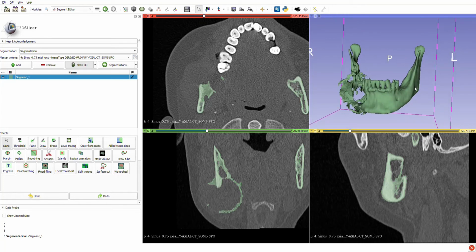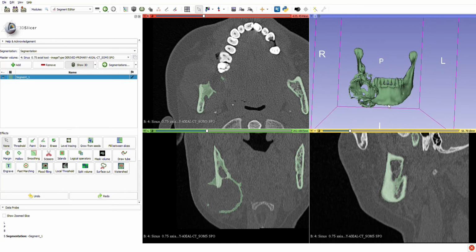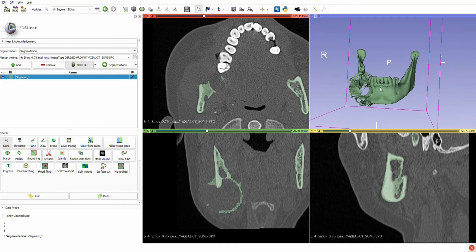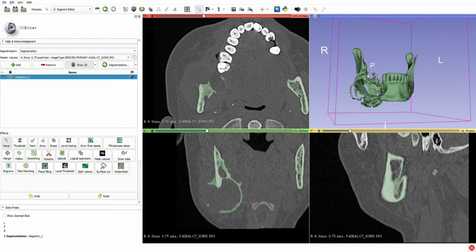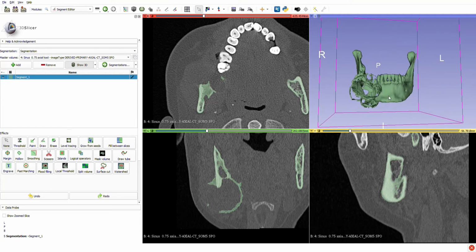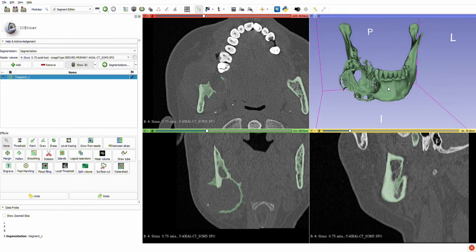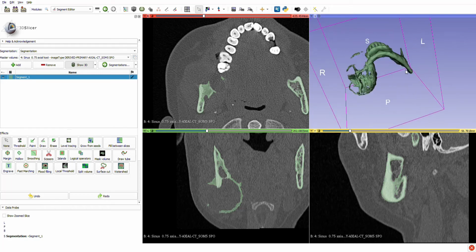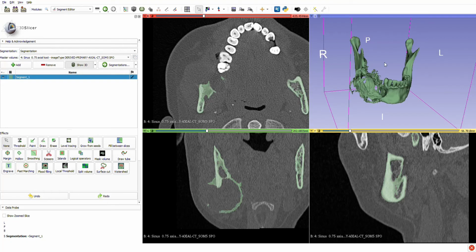And before that, I will make the mirror symmetrical image of the lower jaw just to make a normal bone appearance for the bending of the plate for connecting the future graft to the native bone.